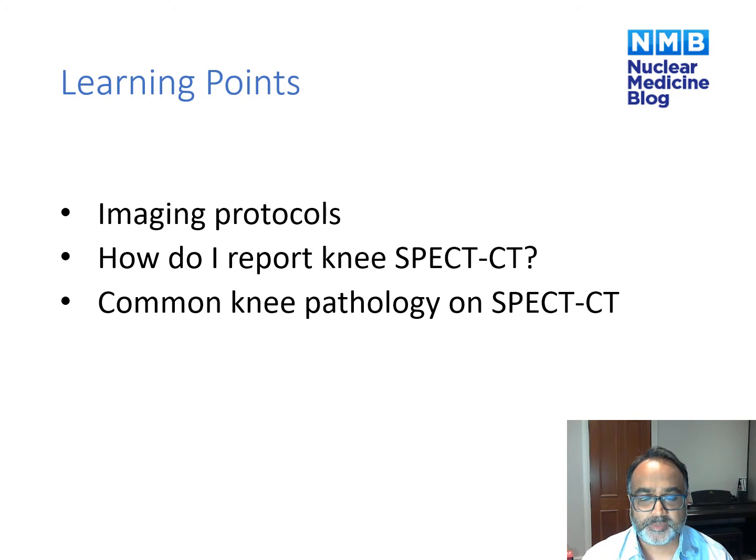In this talk, I'm going to go through our imaging protocols. I'm going to take you through how I report SPECT-CTs of the knee, and I'm going to explain to you some common pathology that you might expect to find when we're looking at knee SPECT-CT scans.